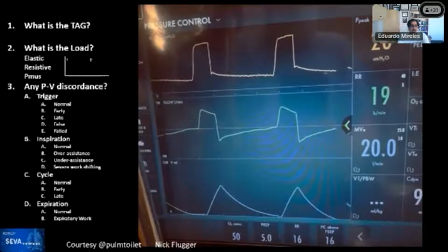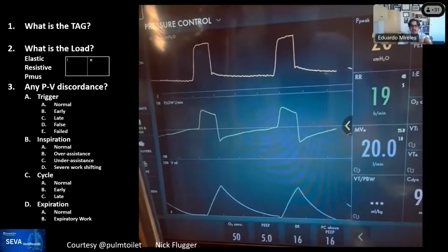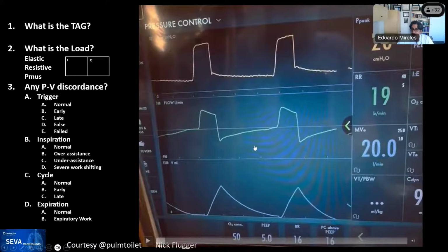So there's a lot to digest through this ventilator sequence, and I presume that many of you recognize what type of breath sequence is occurring on this patient. Perhaps we can start by if anybody recognizes what's the breath sequence that we're seeing here, what's happening on this patient. And you can put it on the chat. That's the easiest pathway to happiness. And put your thoughts.